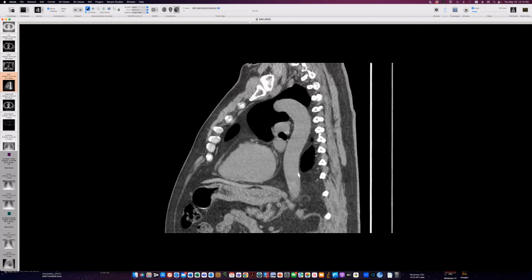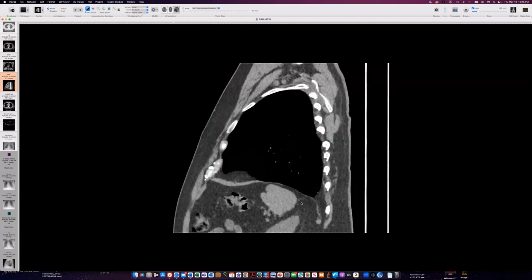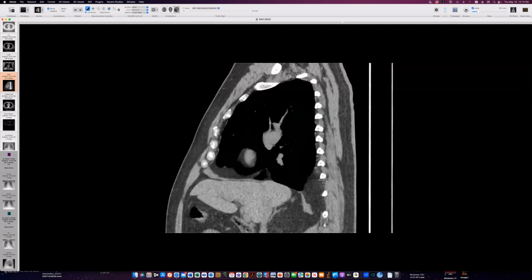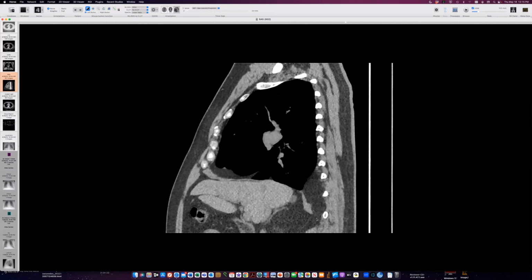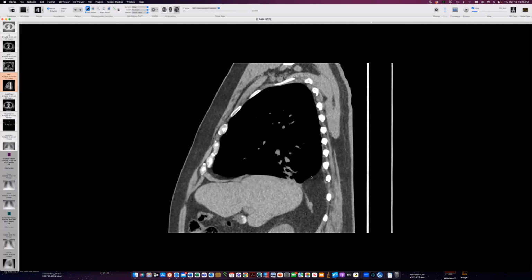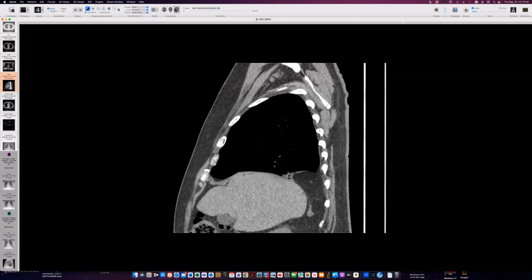So this is the defect on the right side, and let's go, is it the right or the left, and let's go across to the other side. So that's the left, and then here's probably a more posterior defect here on the right with all of this fat. Doesn't this look as if it could be outside the pleural space? You know, chances are it's in the pleural space, but so what do you think, Jeff? I mean, does it look contained, or do you think it's just like trying to be a pleural effusion made out of fat?